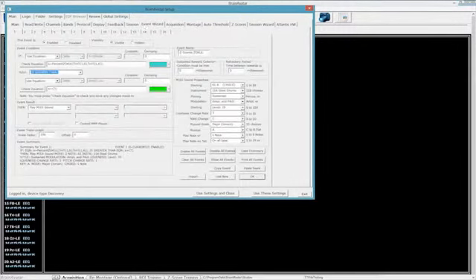This is where it starts scaring people. Now you have a damping that you can do on it. What's a damping? A damping is basically a number put on it to slow down the rate that the data is coming in. If there is zero damping on it, the data is going to come in instantaneously. Whereas when we start putting a number on there, you're going to notice that the number starts rolling. So let's just say in this one right here, let's see if I can show you a good way. And we're just going to break this down bit by bit for you.